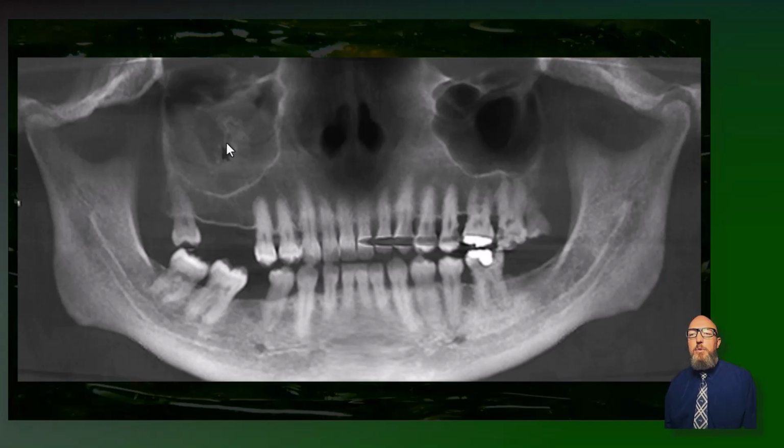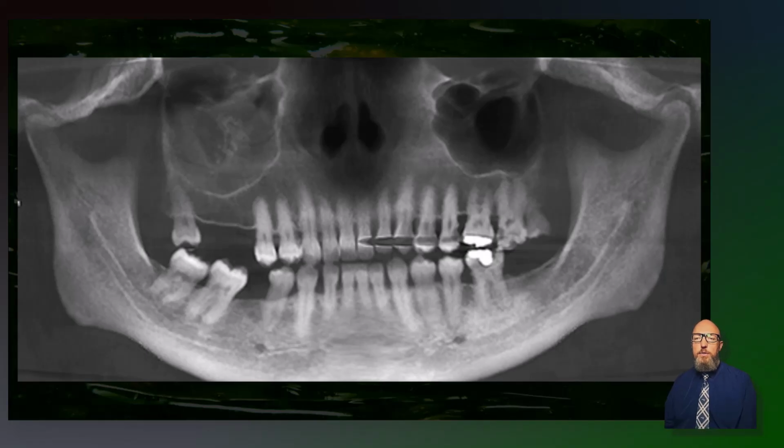And this was Aspergillosis. This was a young woman after induction chemotherapy for leukemia. And so she was left immunocompromised, which made her more susceptible to this Aspergillosis. And pay attention to that, particularly in immunocompromised patients, those with leukemia, or perhaps on high-dose corticosteroids.